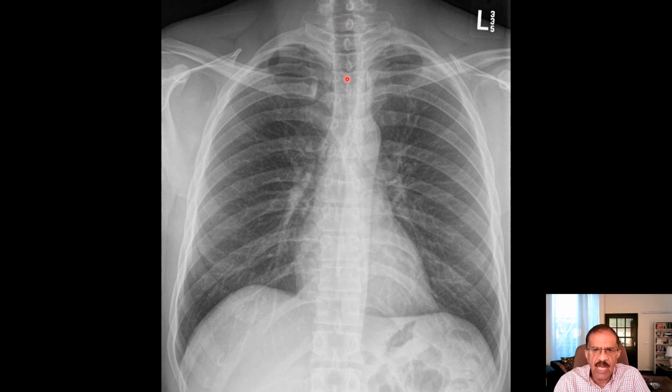You can see the trachea, you can see this is the bifurcation, very clear left main bronchus, very clear right bronchus, and these are pulmonary shadowing. This is not actually the first rib, this is the lateral process of the last cervical vertebra. This is the first rib, and then you can see the other ribs. Costophrenic angles normal, both sides. Diaphragm normal, both sides. Cardiophrenic angles normal. Then aortic knuckle, aorta, left cardiac border, right cardiac border, everything normal.